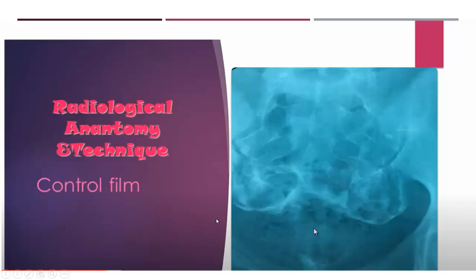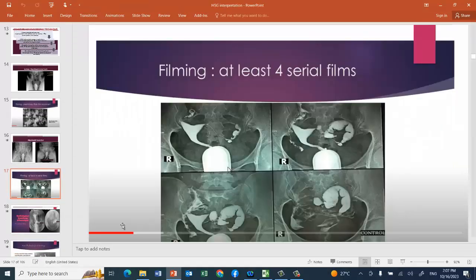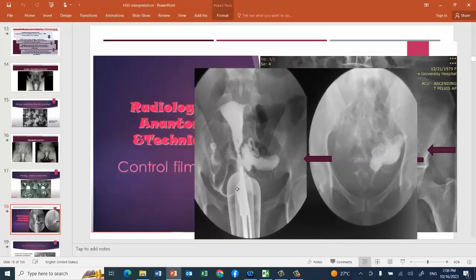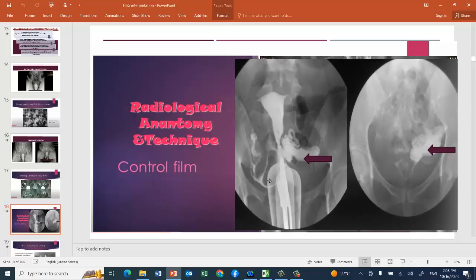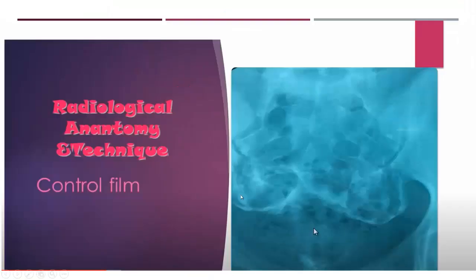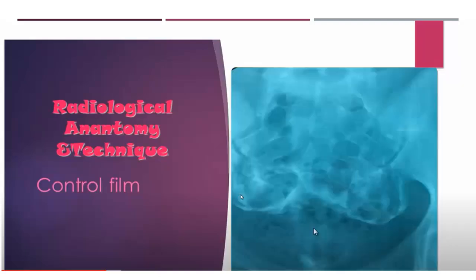Then we come to the radiological anatomy. There's another case. This is the radiological anatomy. There is a slide before this one. Okay, this is just regarding the control film.